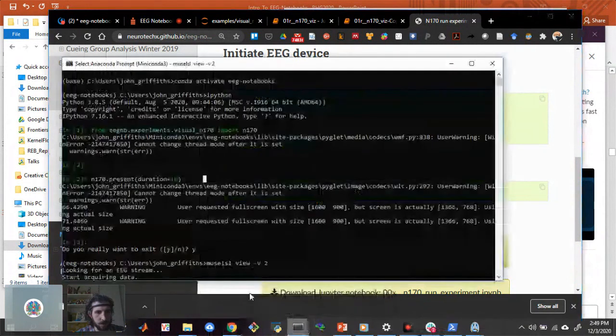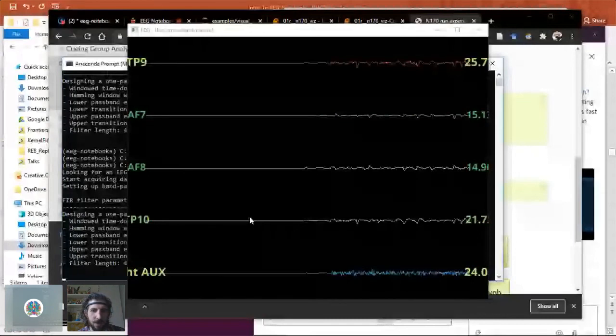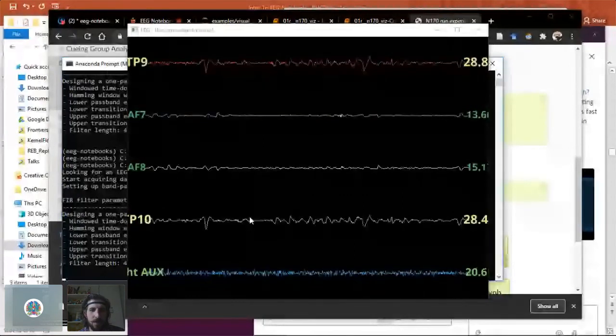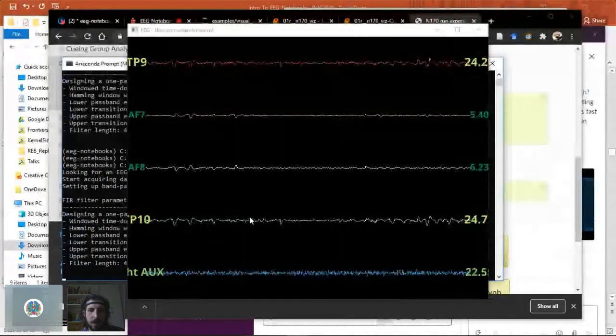Let's just see, okay, that didn't run yet because I needed a little bit longer. Let's give this a second. Let's see if I have a slightly better signal in my temporal channels right now. Yes, I do. Okay, so that was just to convince you that I was getting a bad signal because I had those headphones on, and that would be important especially if I was doing an auditory experiment, and you need to be aware of things like that. You can see the variances flashing up on the right hand side. I could also, to show this is real time, just do some quick teeth gnashing.